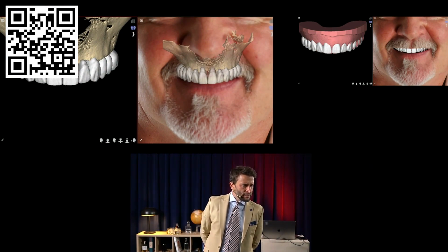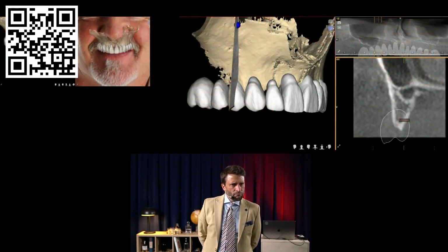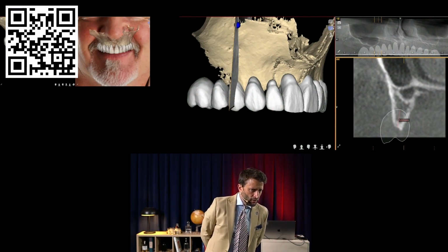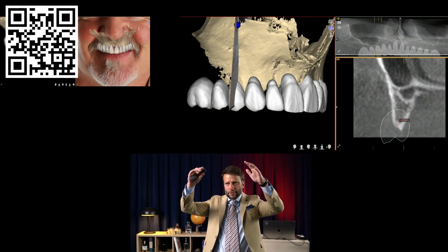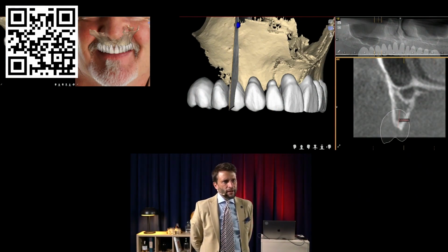Now the patient has a lot of vertical bone there. So immediately we say, if this is the smile design for this patient, look only at the molar. Look how much bone we need to remove. We need to remove this bone and then even more to have the head of the implant above the molar to give space to the emergence profile, right? So we definitely see a problem there.